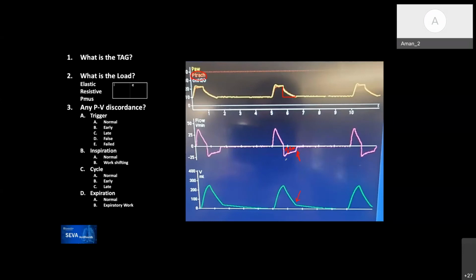Well, it's not exactly zero, because otherwise the volume would have been down to zero too. I think it's just a scale factor that you can't see. It's a very low flow. It's not zero because you're still exhaling. Yeah, that's a good point. I was just wondering, if the resistance in the circuit is coming down, why is the expiratory flow decaying, for the same pressure differential? Because we're at almost the same pressure differential, the flow is decaying.